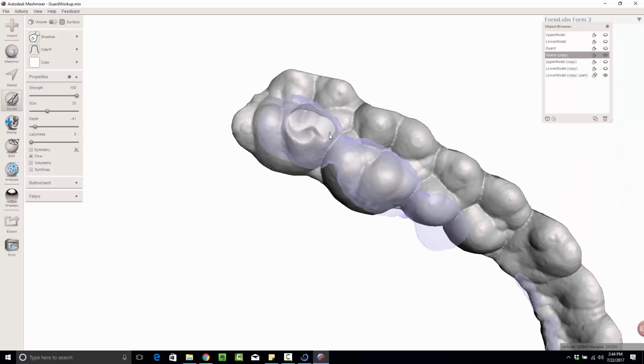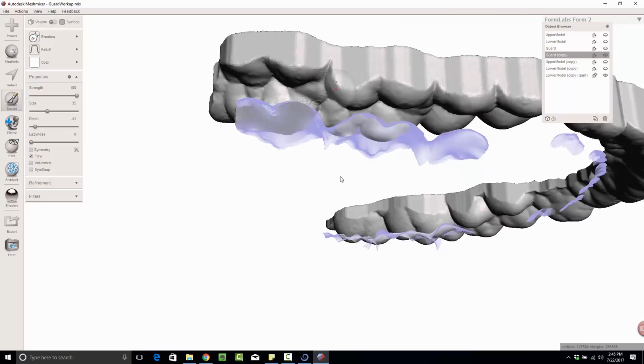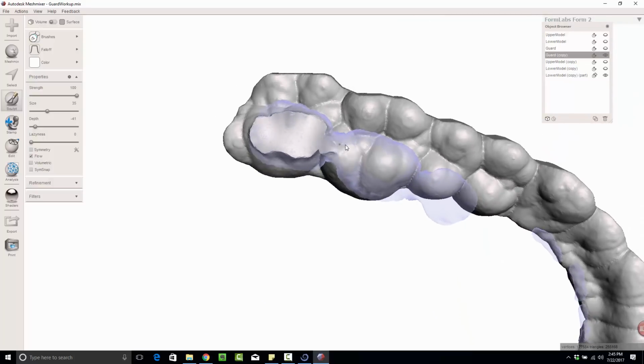So now I can do whatever I like here, and let's see what's happening on the underside. Nothing. It's staying completely intact. I'm going to drag across and keep going. So now I know that those surfaces are all going to have occlusion in these areas.